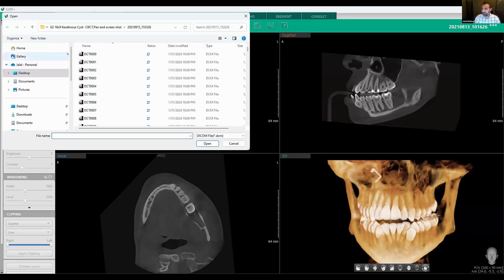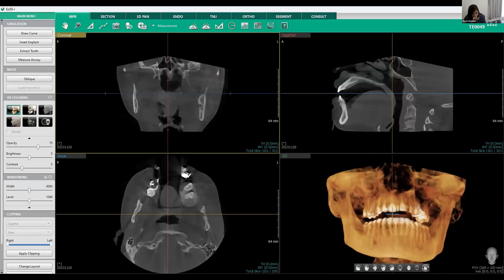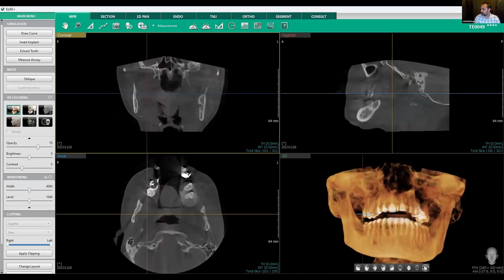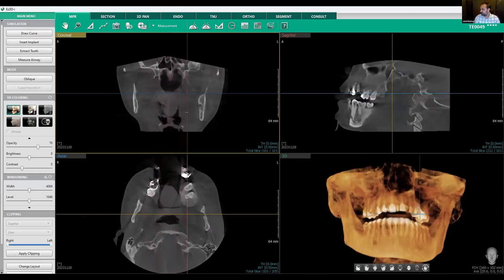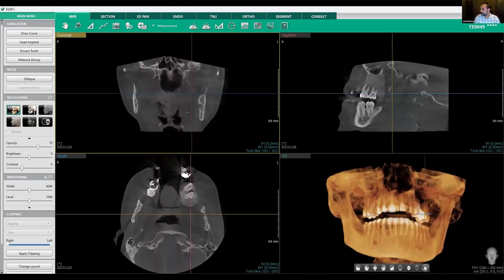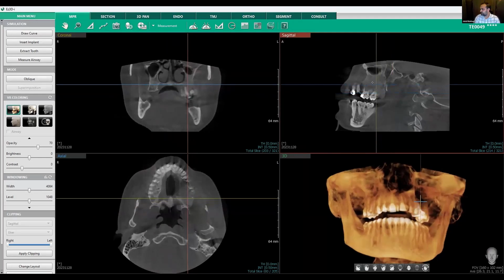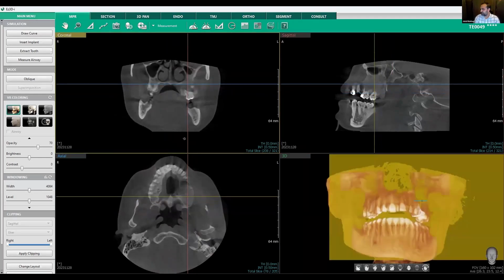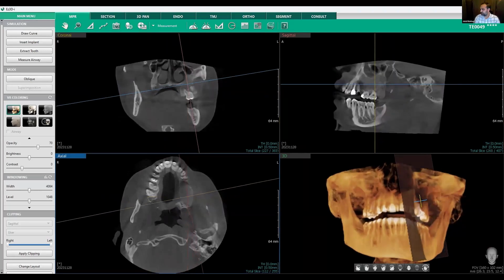And I'm going to show another case, which Dr. Biccolini actually went through in the images. So I reset the scan at this time, and I'm going to scroll through a couple of slices just to see where our area of interest is. And immediately we can see that the left posterior maxilla is our area of interest. So I'm going to move the cursors here to the area of interest and try and orient myself along the path of the pathology.